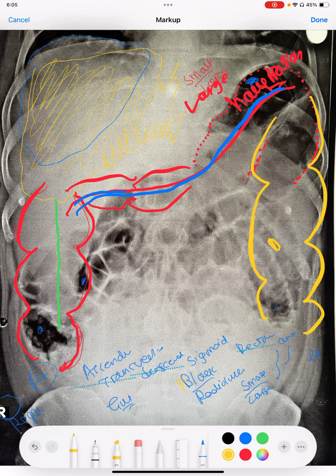This is descending colon. Once descending colon comes here, we have S-shaped sigmoid colon here, and in the middle we have rectum, and then there will be anal canal, so that it will be thrown out of the body.